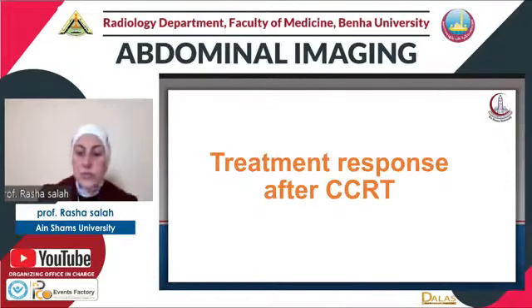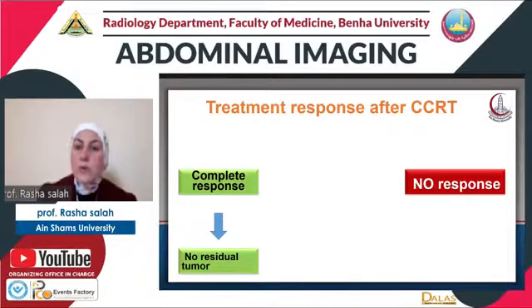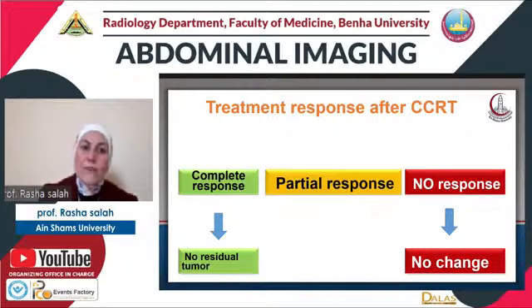How can we assess treatment response after concurrent chemoradiotherapy by MRI? Treatment response is either complete response, when there is no residual tumor visualized radiologically, or no response, when there is no change between the pre-treatment MRI and the post-treatment MRI. Then we come to the dilemma of partial response.